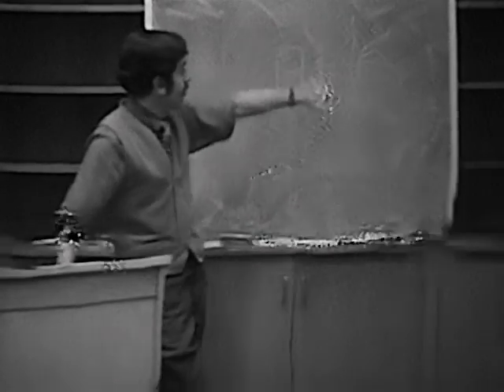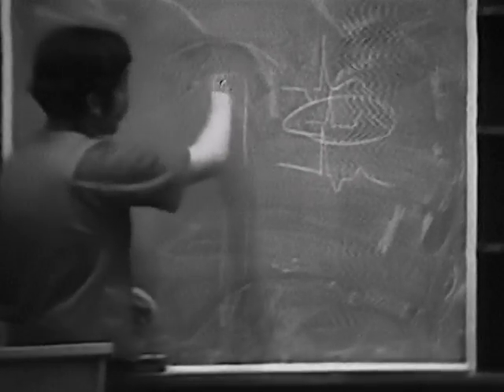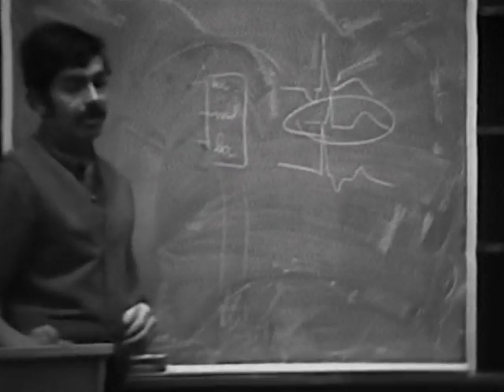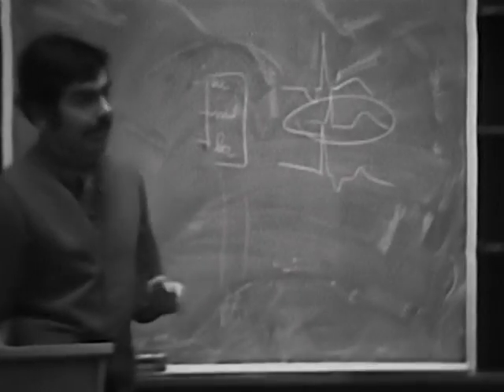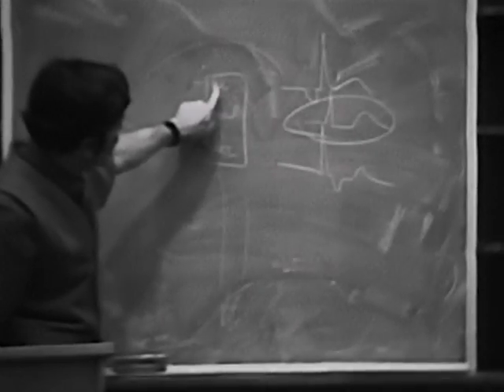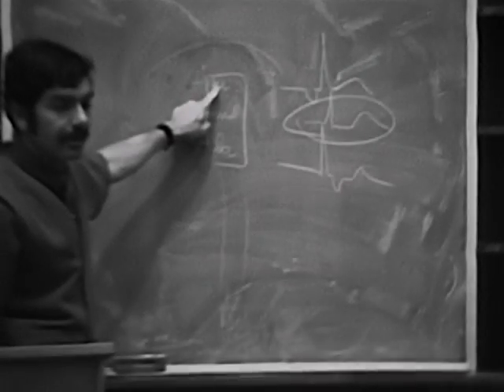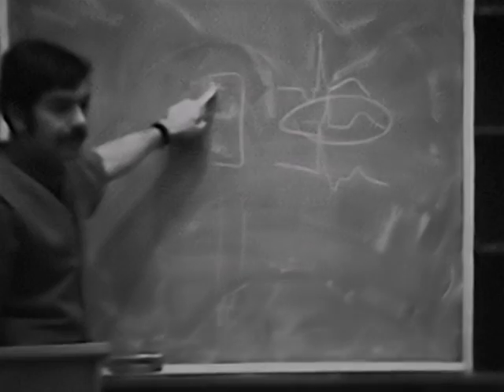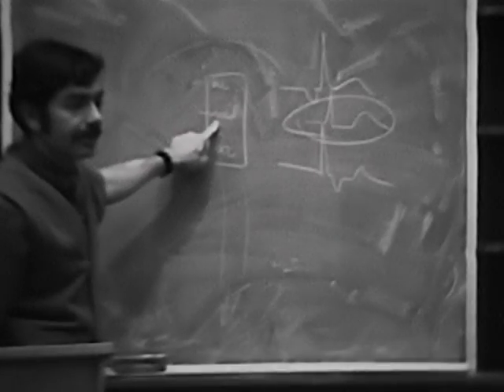What's really taking place is that you have varying degrees of retrograde block. Right? In other words, these impulses start here, and they go up, and they're partially blocked, or they're completely blocked. So let's just think of what might happen. Suppose we're dealing with a high nodal rhythm. Do we have a lot of block or not very much block? Little block. And what would mid-nodal be then?